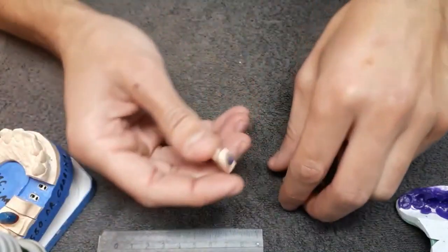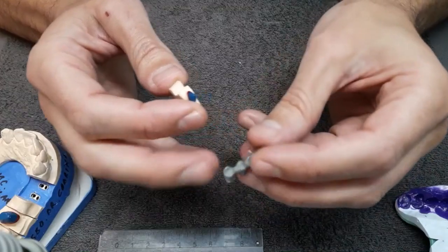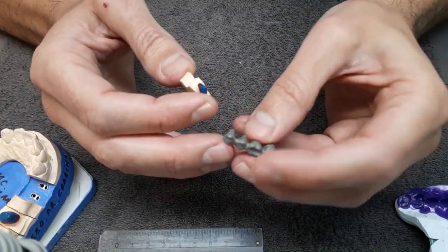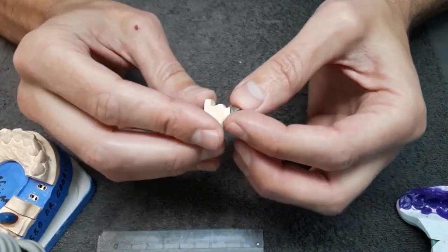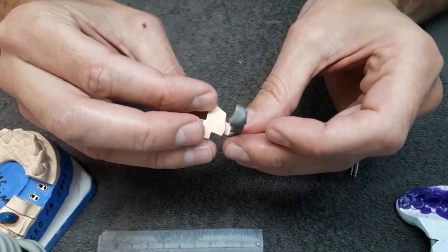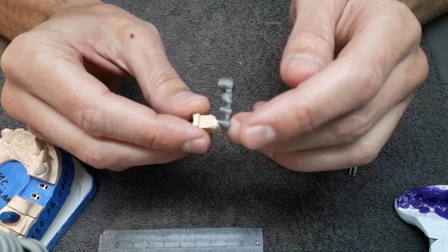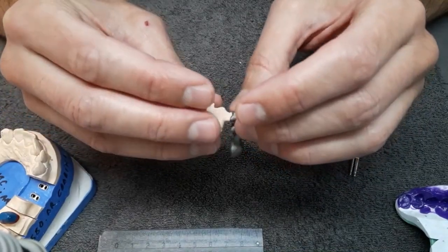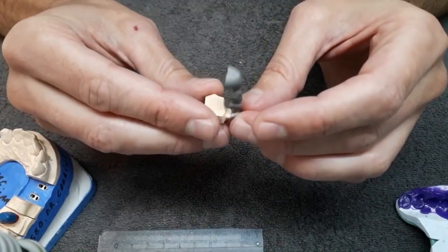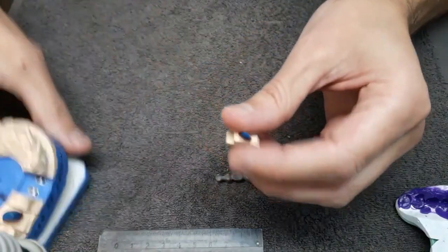Why do we need such removable dies? Well, this is a metal framework for metal ceramic restorations. It's actually a metal ceramic bridge, the framework of the bridge, and you see it here on the model. If the die is removable, we can easily see the nice and clean margin closure, the margin fit. So this is why, to check the perfect fit and to produce the perfect fit.